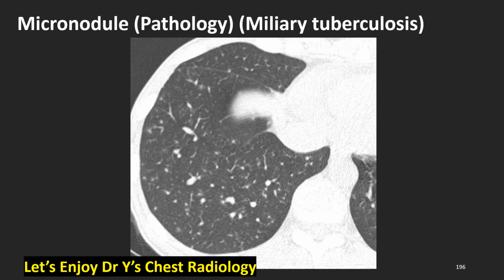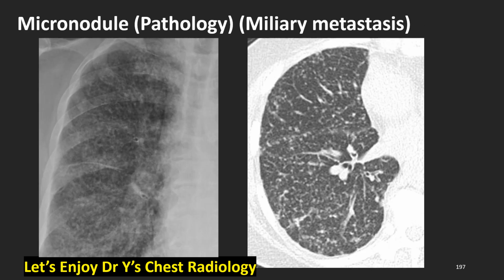Micronodules pathology. We see many micronodules of miliary tuberculosis. Micronodule pathology, miliary metastasis. And these micronodules are miliary in pattern of lung metastasis.